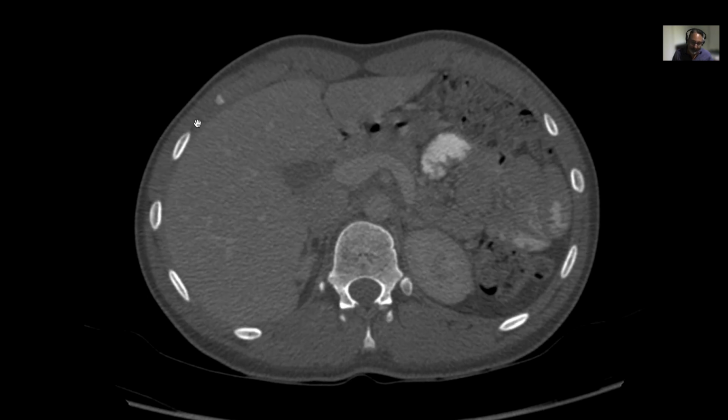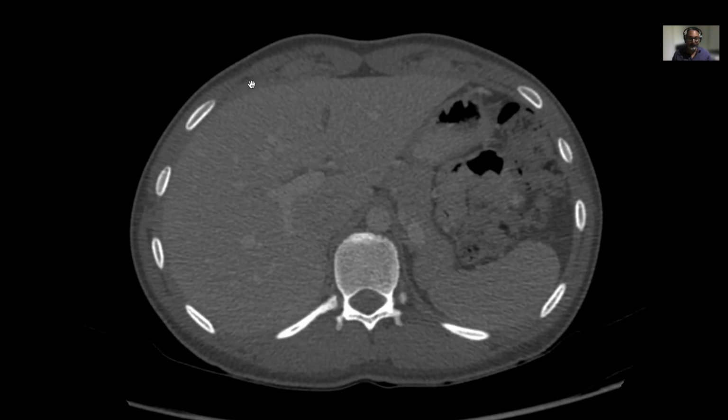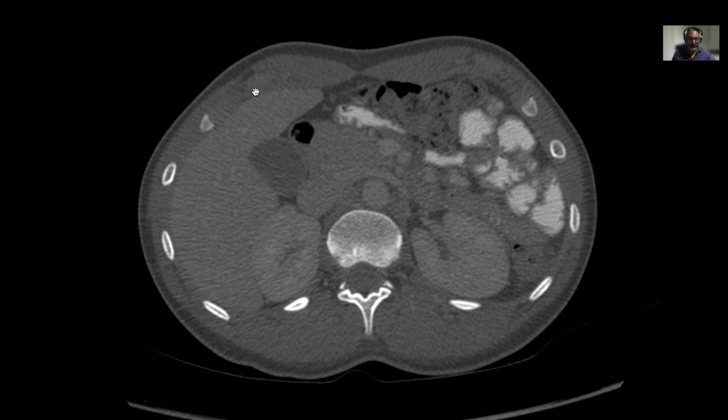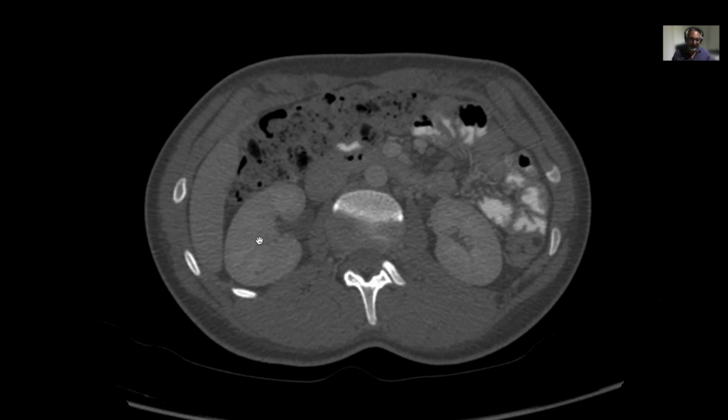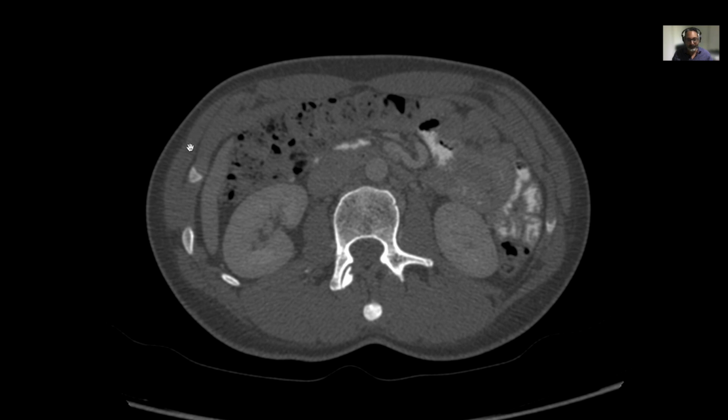And you should be able to see those three muscles here, especially as we go further down into the abdomen. As we go further down, these muscles will become more apparent, and there will be a point where you should be able to see them quite clearly. So that's the external oblique, that's the internal oblique, and that's the transversus abdominis. You can see it here also.